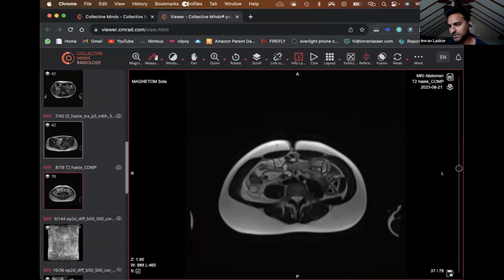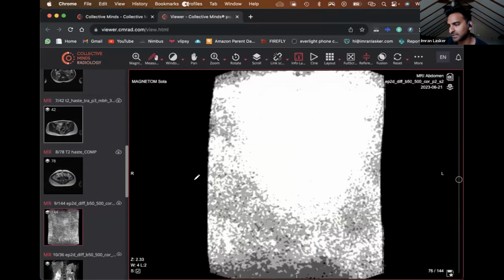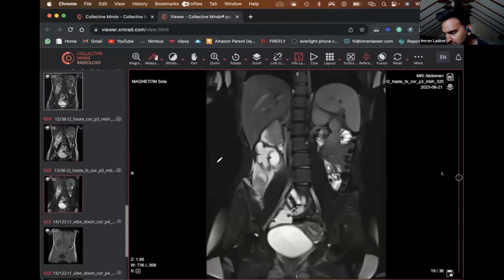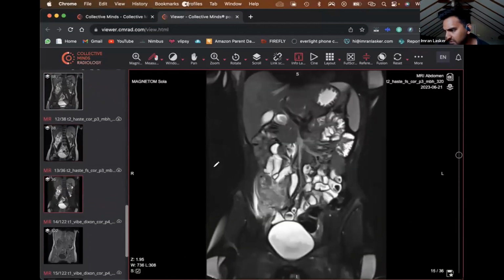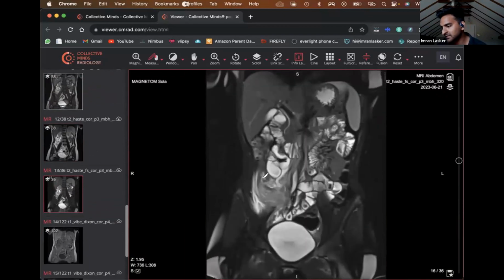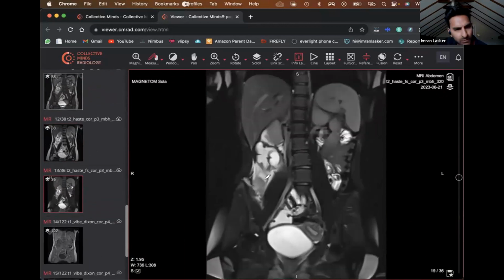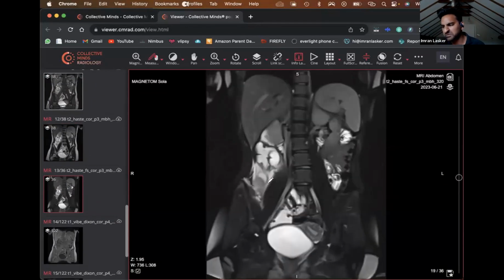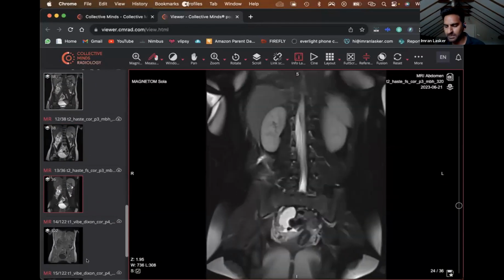So therefore, this would be an MRI appearance of appendicitis. And interestingly, hopefully it's come across. So let's see if I can show it to you on this image. Again, you can see lots of fluid located within that region. And then, how old? How should we consider underlying factors? I mean, appendicitis can happen at most ages, really.